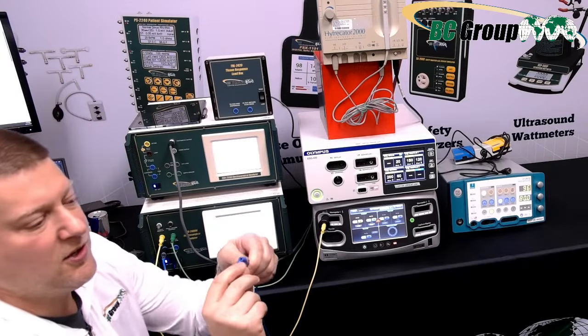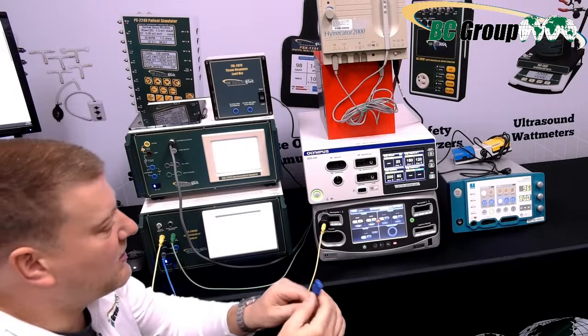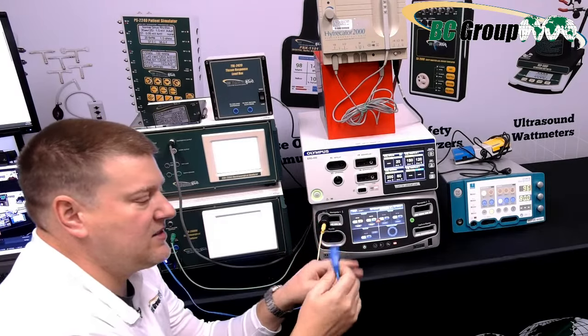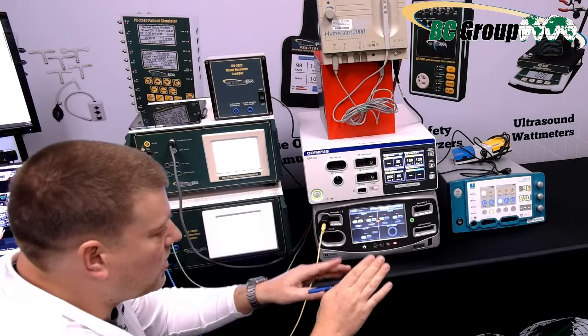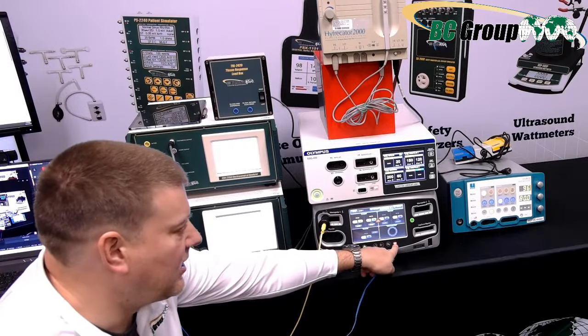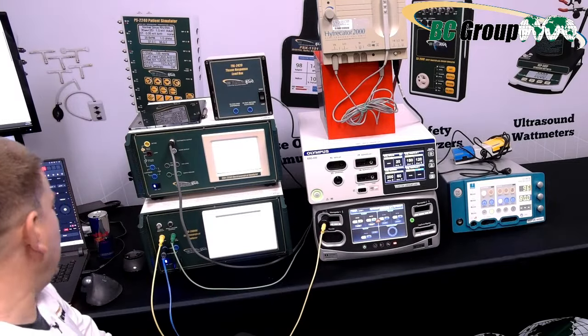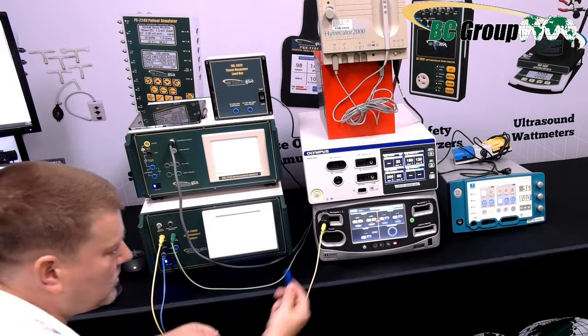There is a little dingle hopper, that is the official term by the way, that sticks out right here that will signify that this guy is either a split electrode, so it measures resistance between the two, or a single electrode. And you see a little indicator right here on the front of these ESUs, and that is going to signify what mode you're currently in.